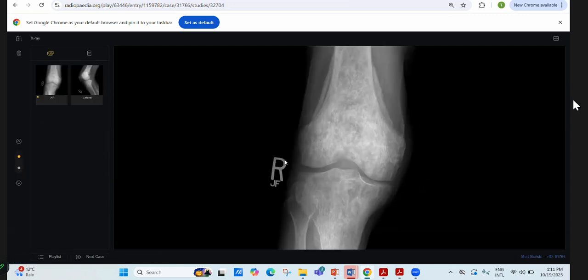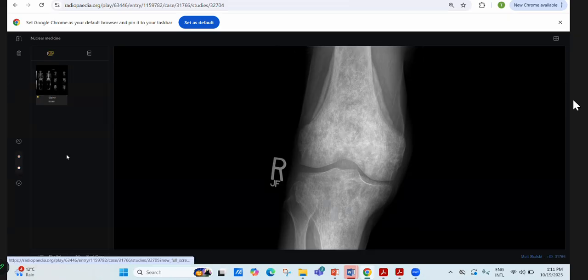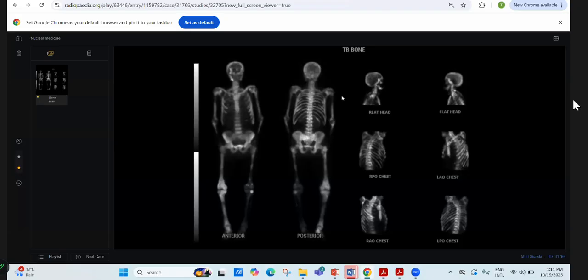And yeah, this is the case. Mostly these cases are just for the discussion, like if the patient is this age, 60, male. Obviously you did really well with the alkaline phosphatase and PSA, and they ask for the PSA simple test. The only learning point in this is you explained the bone scan too little. You straight away said no renal uptake. First you explain where the uptake is, and then further you explain there's no renal uptake.